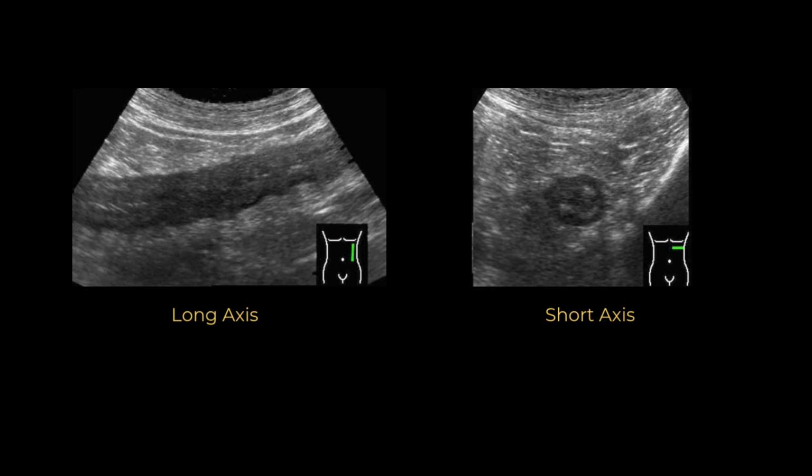This happens due to edema and hemorrhage in the submucosa. The thickening is usually symmetrical and involves a segment of bowel, most commonly in the left colon. Wall stratification depends on the stage. In the early stage, it is preserved. You will see a thick hypoechoic submucosal layer due to edema. In late stages, stratification is lost. This is a red flag and suggests full thickness necrosis.